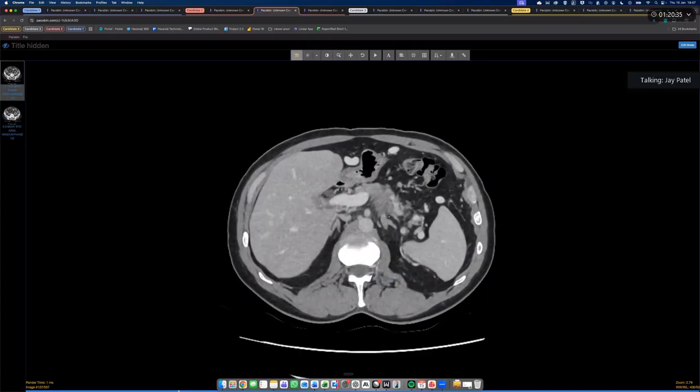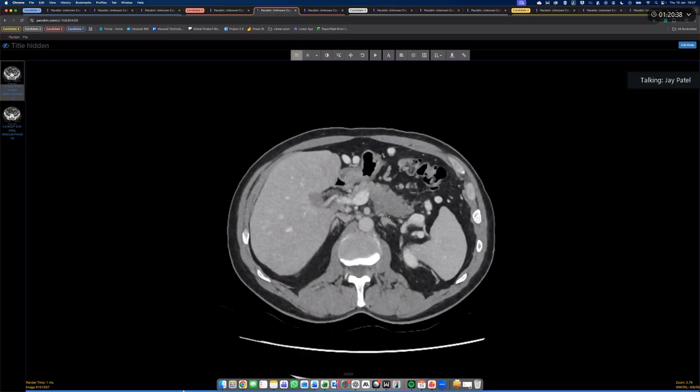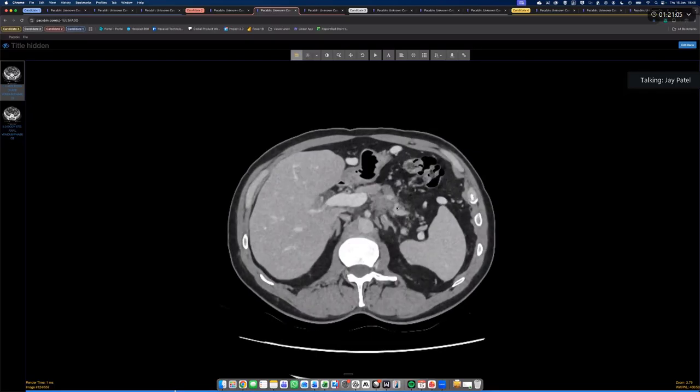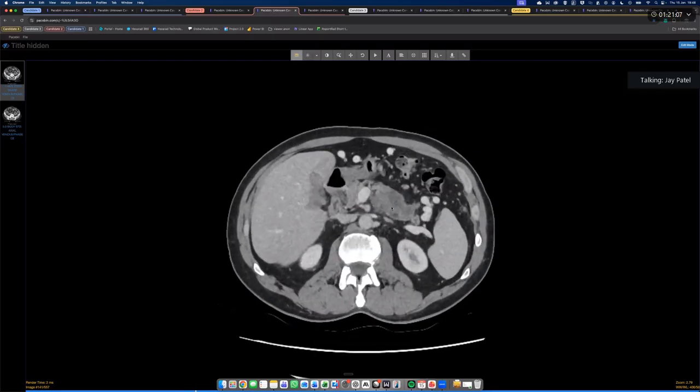Generally, when you're thinking about pancreatic cancers, what they do very well is obliterate local blood vessels. And by that, I mean they more likely squash them rather than thrombose them, because they have quite a lot of local mass effect, pancreatic malignancies, but they do also cause a prothrombotic state. So they do also thrombose. So in this case, you're right to say the splenic vein is entirely obliterated by the primary tumor.